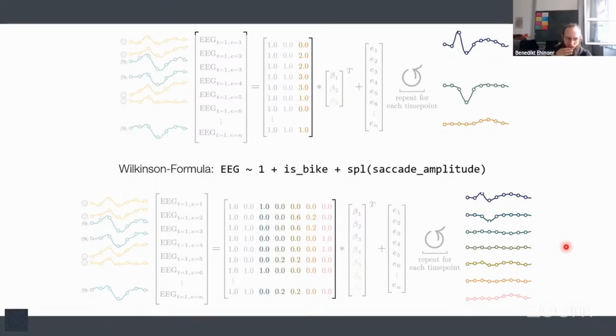And if you come from the MATLAB Unfold toolbox, there are not many, but I mentioned it anyway. This is what we implicitly implemented there, also with the uf_predictContinuous combination. But back then we didn't know better that this is all called marginal effects, and in the Julia version, it's a little bit more conceptually straightforward.